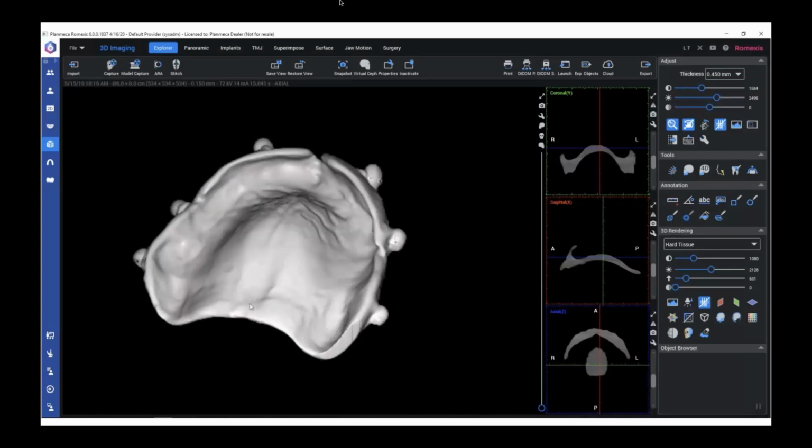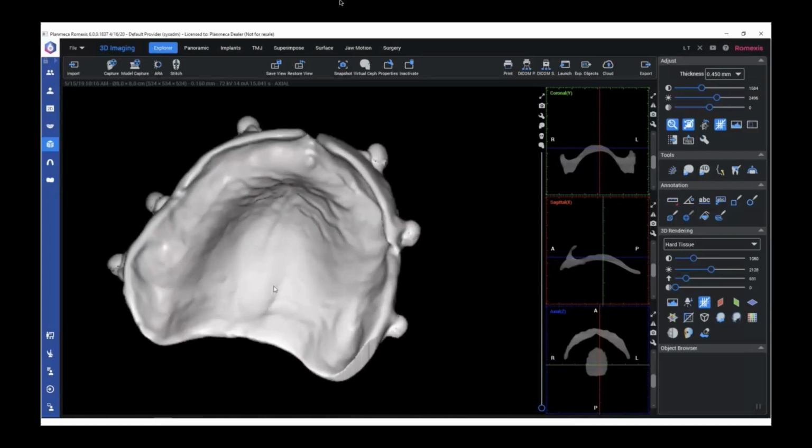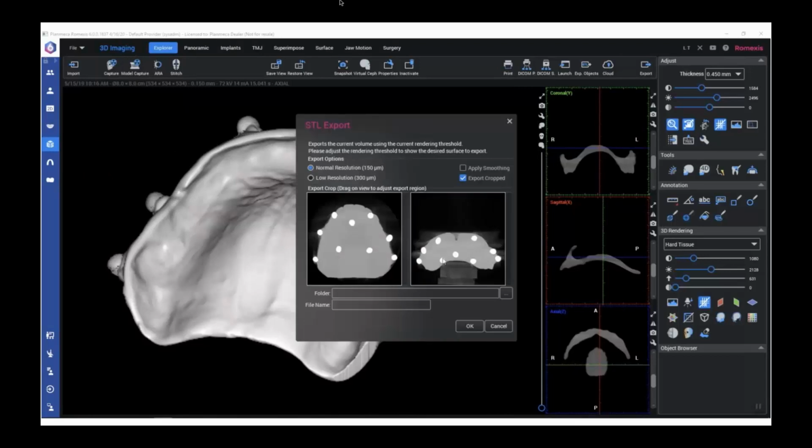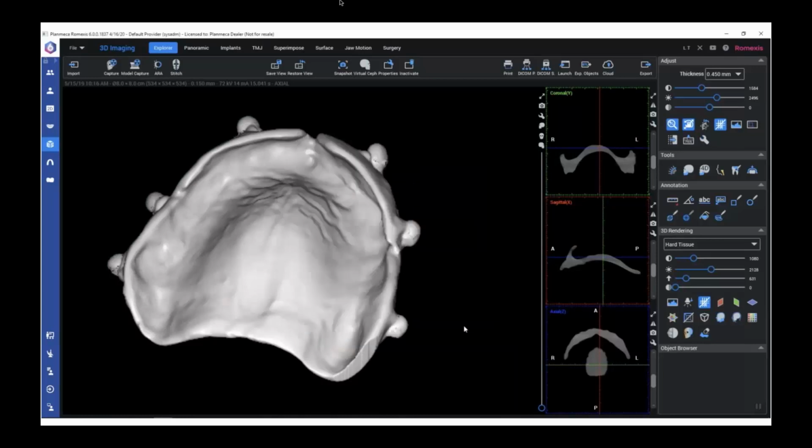This is the CT scan rendering of the denture itself. And you can see these model scans are exquisite. So the days of having to duplicate a denture with alginate and things like that are over for sure. Using the denture itself and taking a scan is fantastic. You could even use this to create a custom impression tray. You know, you could 3D print that. You could even cut the teeth off and use it as a possible try-in denture with wax rims. I mean, you can get really creative with this technology because now we have a three-dimensional model of this.